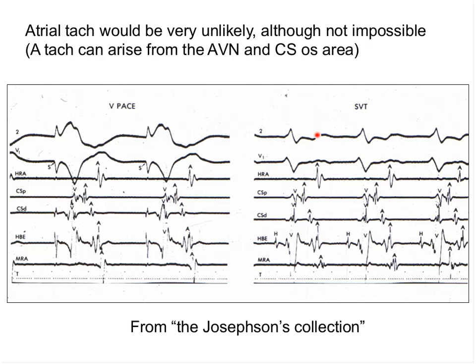So there is a structure that is connected to the ventricle that produces an atrial activation sequence identical to that during tachycardia. That makes it very likely that there is a structure at the AV junction participating in the tachycardia, and this would not be expected if the tachycardia was an atrial tachycardia.